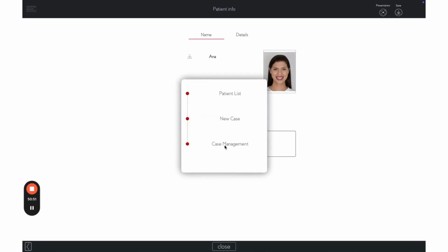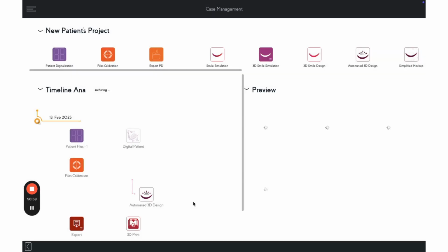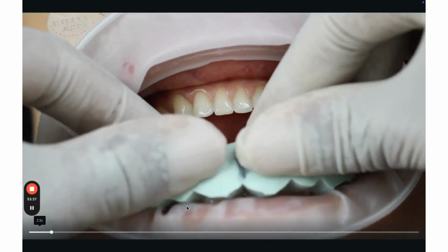And now let's go back to our case management. Here I'm going to show you the end result.